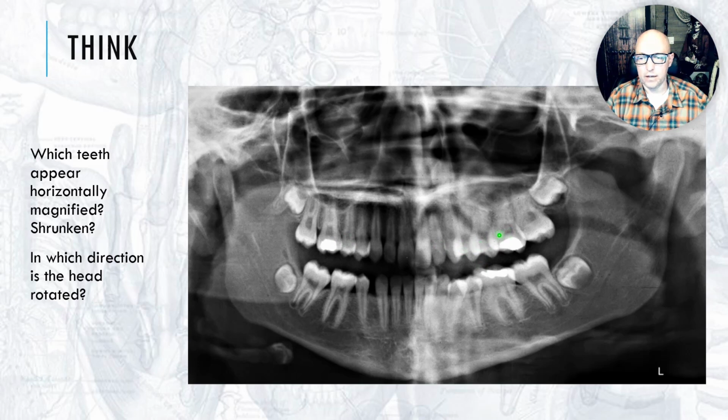This is the left side. I just said that wrong deliberately so that you can learn. We always talk about the patient's left. That was not deliberate, I'm kidding. We can talk about the patient's left when I point on the right side of the image. That's always going to be the case in radiology. Patient's right is always on our left side. So I'm going to call this the right, this the left, just so we're always clear about that.